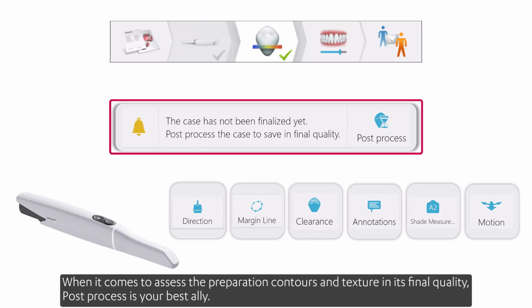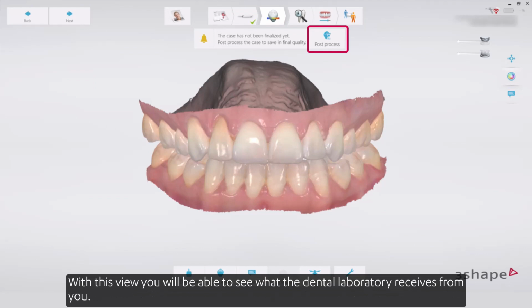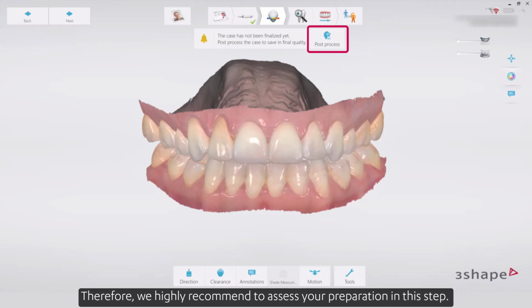When it comes to assessing the preparation contours and texture and its final quality, post-process is your best ally. Post-processing is the conversion of acquired streams into the final 3D models. With this view, you will be able to see what the dental laboratory receives from you. Therefore, we highly recommend assessing your preparation after post-processing.